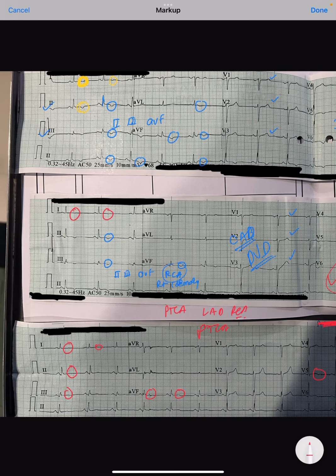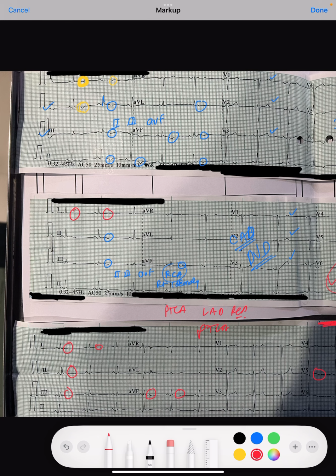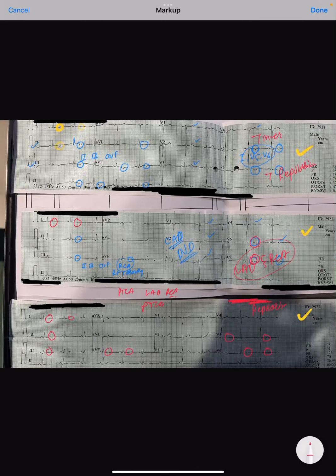So T inversion can definitely signify that there may be underlying blockage, which may not always be there. And after doing stenting to the blocked or thrombosed or affected arteries, the T inversion may markedly improve. This is what we learn from this ECG.